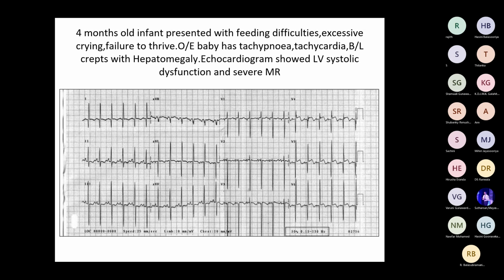Even the child who was in ward 2 had Q waves, right? Had Q waves with whom we diagnosed, right? And it's very important, ALCAPA, because it is mistaken for dilated cardiomyopathy. Even the recent child was diagnosed as dilated cardiomyopathy by somebody else, and said the prognosis is very bad, and even the death certificate was given to that person that he will die within the next couple of months. Luckily, he came to me and I noticed it's ALCAPA, not dilated cardiomyopathy.